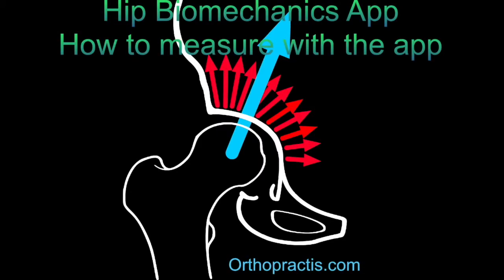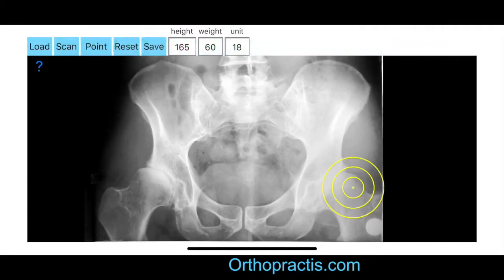How to measure with the app. The first thing is to load one image from your photo library or capture a photo from X-ray photos of a patient. Next you fill in the empty boxes according to the patient's height in cm and weight in kg, and at last the calibration unit box in mm.